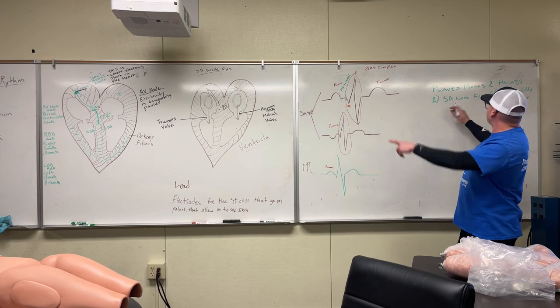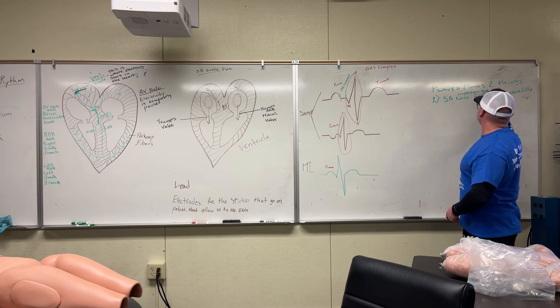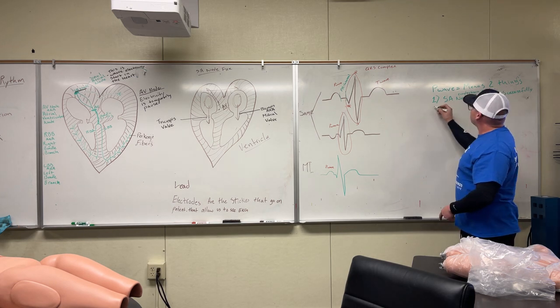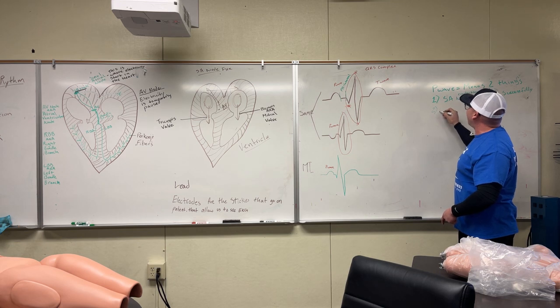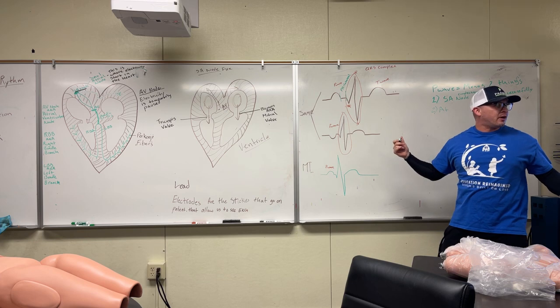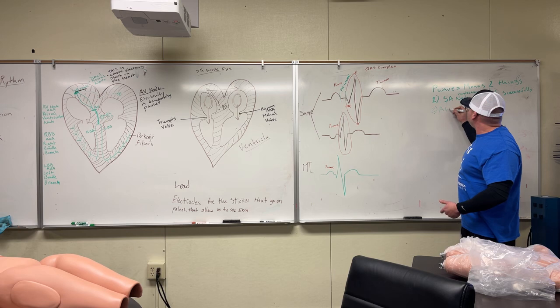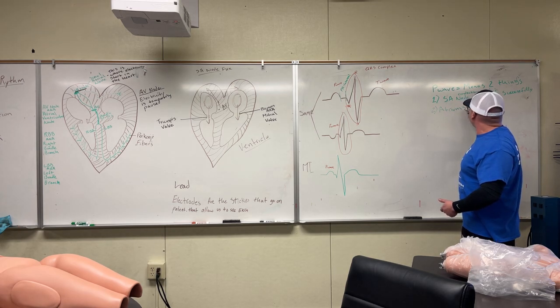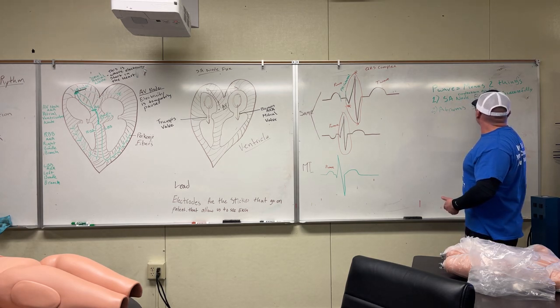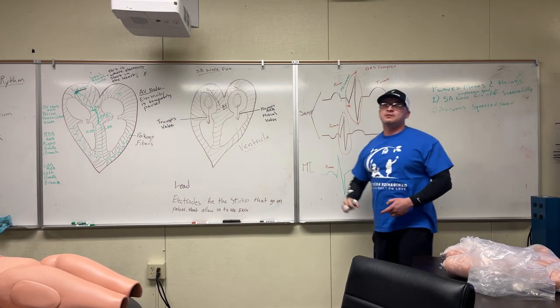Also, so it means it fired off. So conduction system. This is conduction system. Good so far, because we have a P wave. Second thing, it means that the atriums squeezed. They contracted because electricity went through them. Right? We know what electricity does to muscle. It makes it contract, twitch. So atriums squeezed. Good. Okay? So that's what the P wave means.